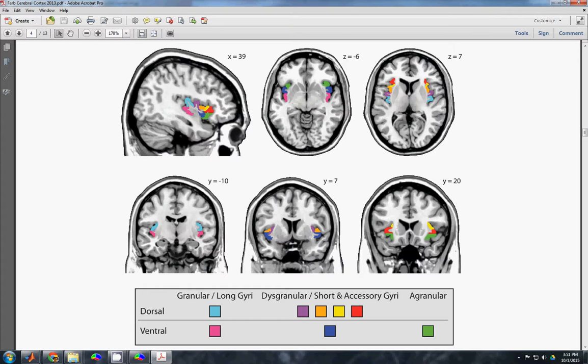So first thing I'd like to mention is we're going to use a numbering convention to identify these different regions. We're going to start from the back of the brain, go across on top and then across the bottom. So we're going to go 1, 2, 3, 4, 5, and then 6, 7, 8 along the bottom. Looking at an axial view, it's going to be 1, 2, 3, 4, 5, and the lower axial view in the middle here, 6, 7, 8.